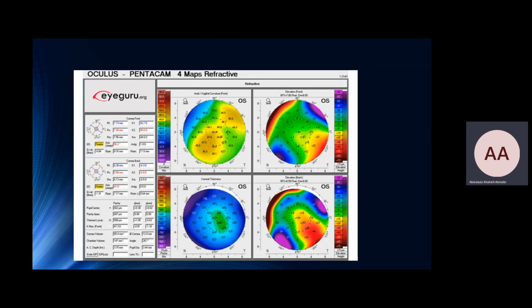The difference between the highest is 46 and 42.2. And then I'll compare the difference between the inferior and superior. It's 46 and 42. What about the pattern of the shape? The pattern looks asymmetric in both eyes, slightly asymmetric with skewed deviation. It's around more than 25 degrees, I believe. So slightly significant. I would say it's 20 degrees since it's slightly oblique.